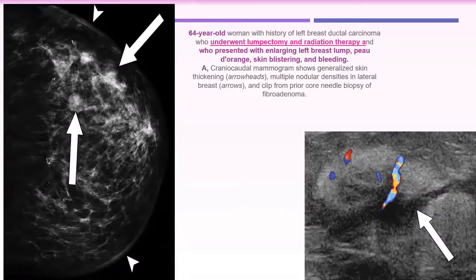Echogenic or hyperechoic. Yes, predominantly hyperechoic, with central low echogenicity, necrosis, and vascular. So I will not say cystic, because I could see within the area what? The same low density area.